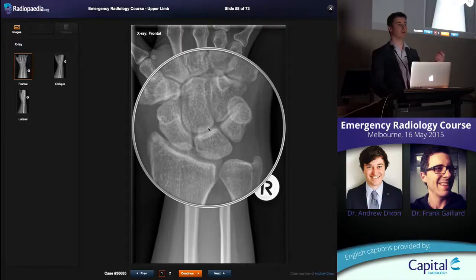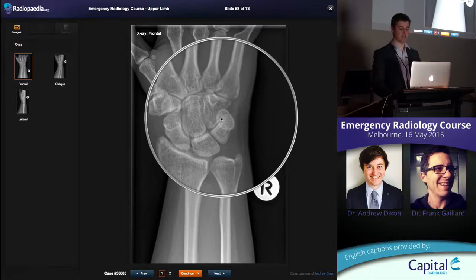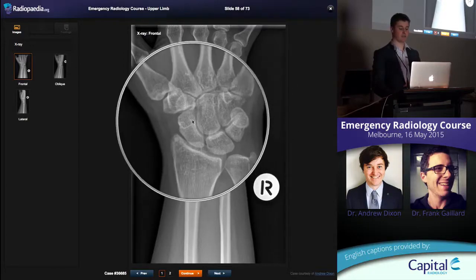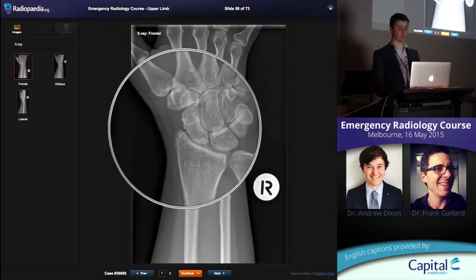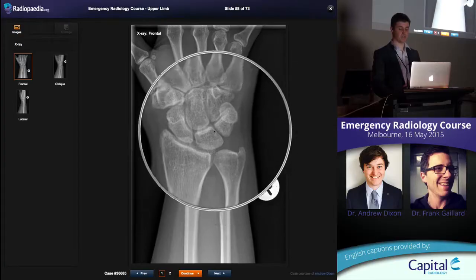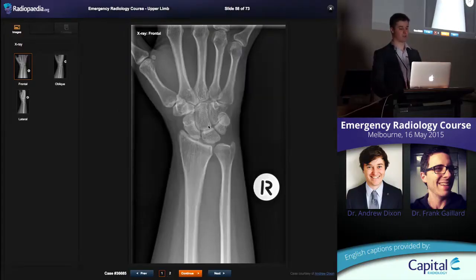So it's important to look for on a normal wrist radiograph. They also have this line, a nice arc. You see here, this mid-carpal line, a nice arc, okay? Down here, proximal carpals, a nice arc, okay? The lunate here, which is this bone here, will often overlap just a tiny bit with the capitate, okay? That's normal, but there shouldn't be a lot of overlap, okay? The carpometacarpal joints, again, is kind of this jagged kind of joint here. You don't want to see too much overlap of those metacarpals with the carpal bones, okay? Just a little bit, not a lot.